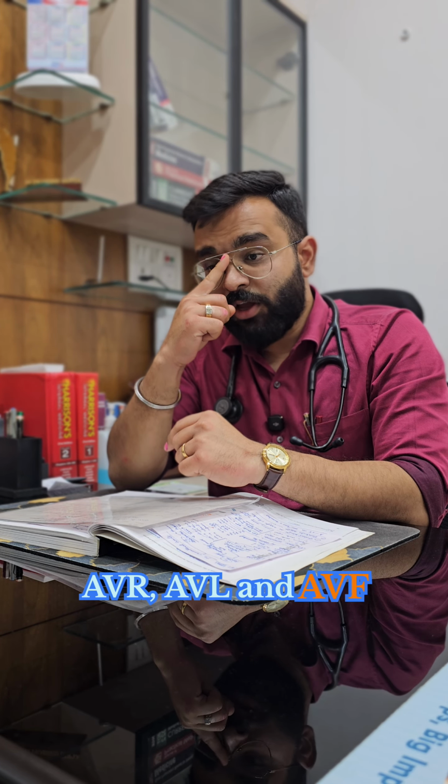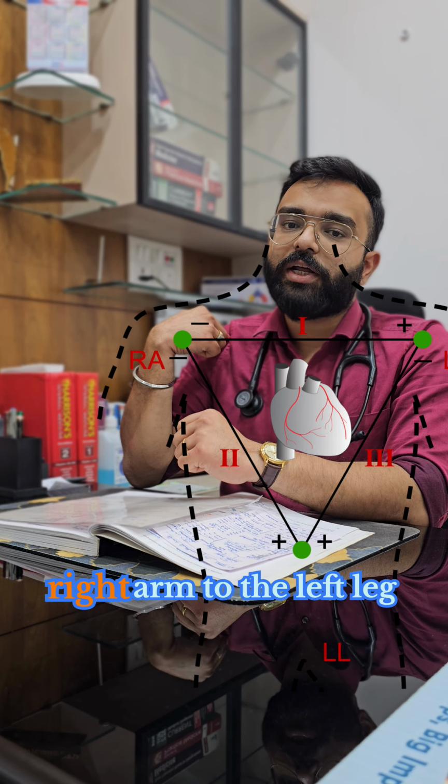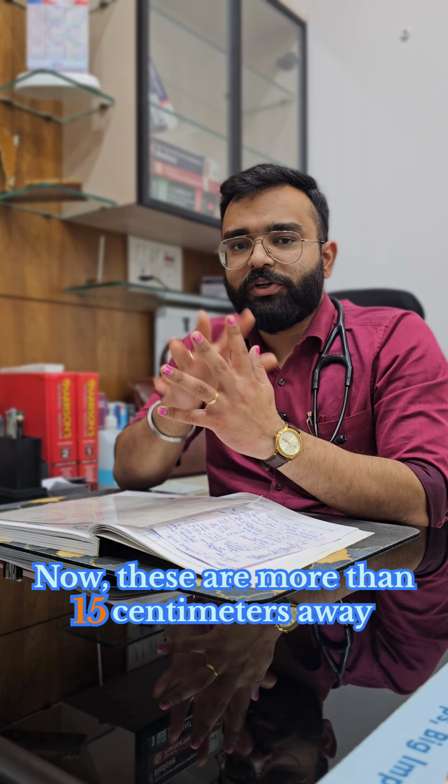Coming to the frontal plane leads, there are further of two types. The 3 standard leads, lead 1, 2 and 3, and the 3 unipolar leads, AVR, AVL and AVF. Lead 1 goes from the right arm to the left arm. Lead 2 goes from the right arm to the left leg, and lead 3 goes from the left arm to the left leg. Now, these are more than 15 centimeters away.